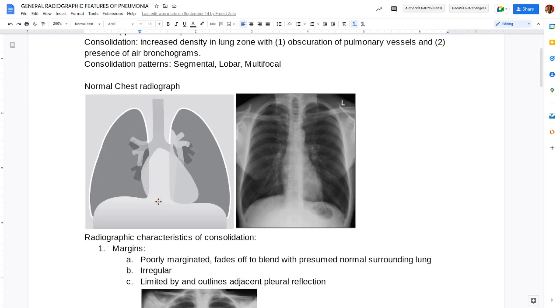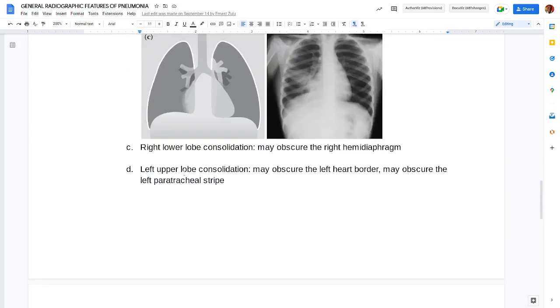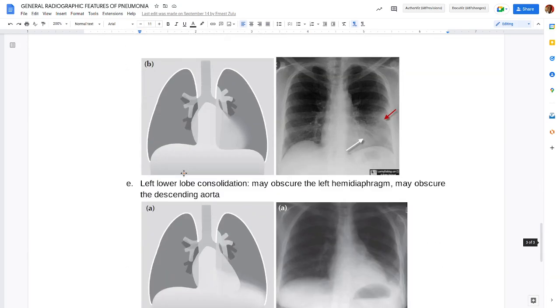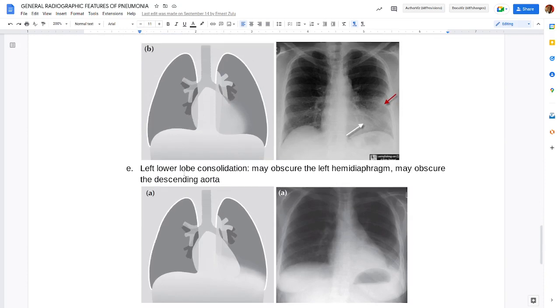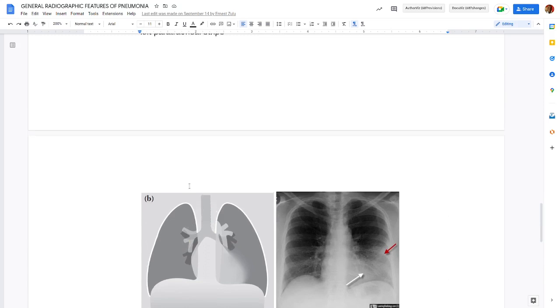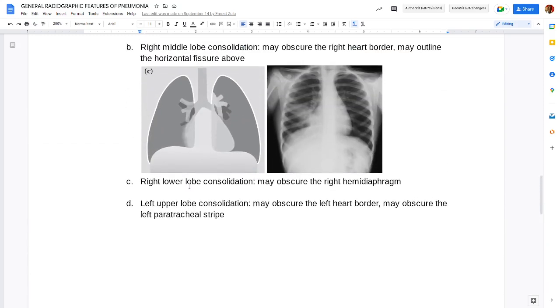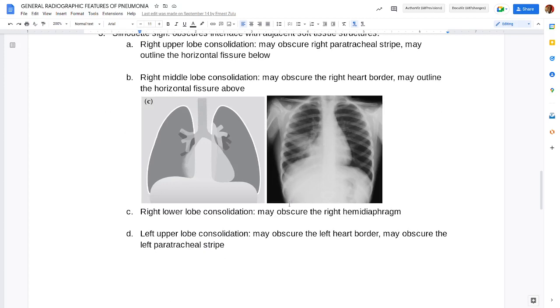Now go down to where we were. Look again on the right side, at that same image. Look at the same border on the drawing.